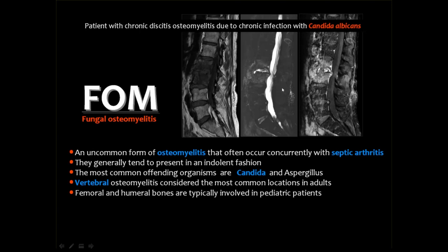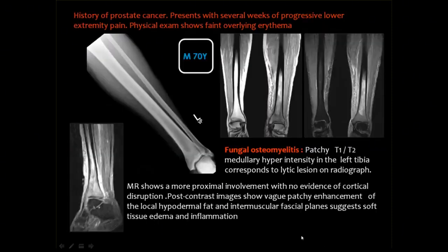spondylodiscitis, where you get an inflammation of the L2-3 intervertebral disc, being bright in the T2 weighted image, and the bone marrow edema of the opposing vertebral end plates. They are black in the T1 and bright in the T2. And after injection of contrast in this T1 fat-saturated image, you get enhancement of the bone marrow edema, enhancement of the inflamed disc, as well as enhancement of the inflammatory granulation tissue.